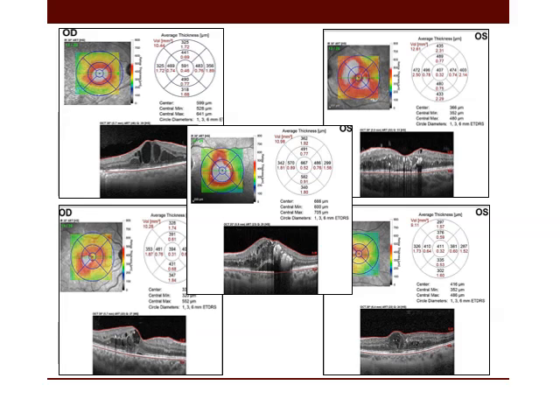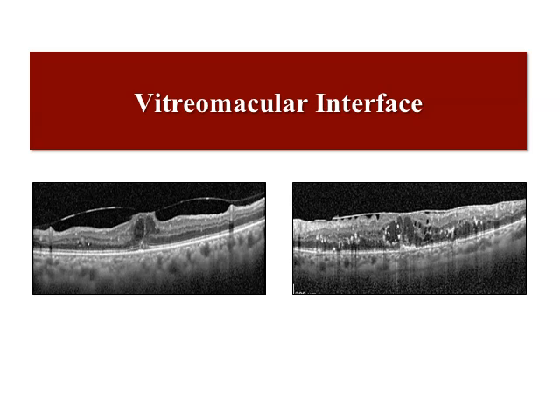Another patient with central involving cystic thickening, foveal serous elevation, and dense hard exudation approaching the central fovea. Patient with small sensory retinal elevation, central involving cystic thickening, few hard exudates and hyperreflective foci.